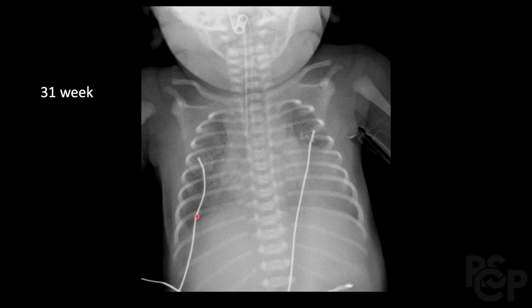And then we don't see any pleural effusion. The costophrenic angles are visible appropriately on both sides. So if we were to follow the chart in the first slide, this would likely classify as a respiratory distress syndrome because this patient is premature. The lung volumes are a little bit smaller than what we would expect. There's bilateral hazy opacities in both sides, and there's no pleural effusion as far as we can see. So yeah, this patient is presenting for respiratory distress syndrome.